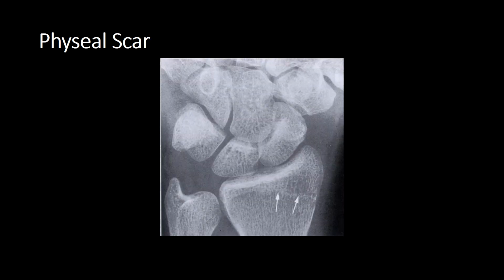Physes may fuse, leaving a residual scar, and these can be quite difficult to differentiate from an undisplaced fracture, particularly in elderly osteopenic women.